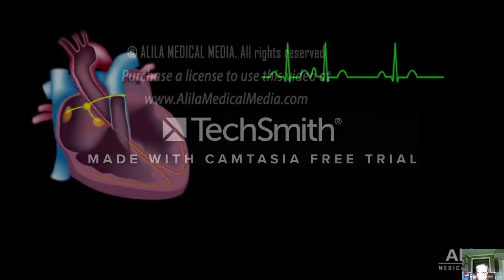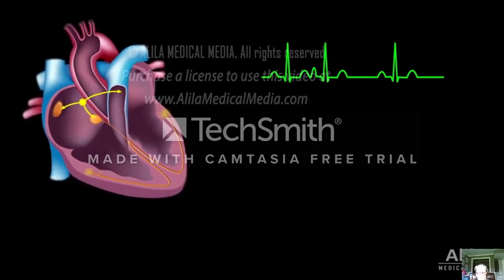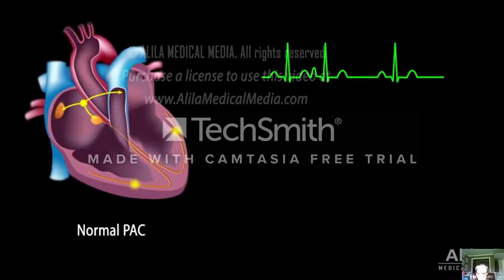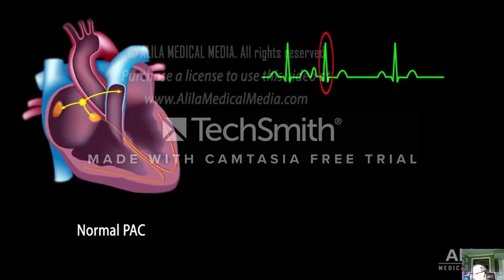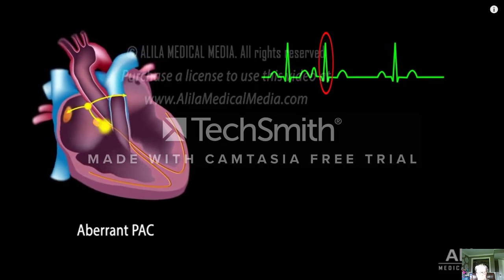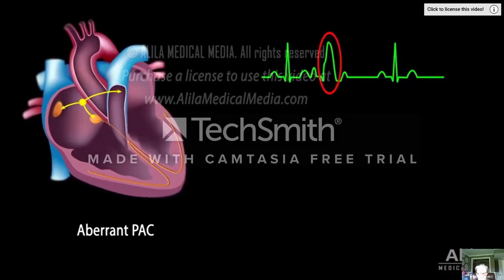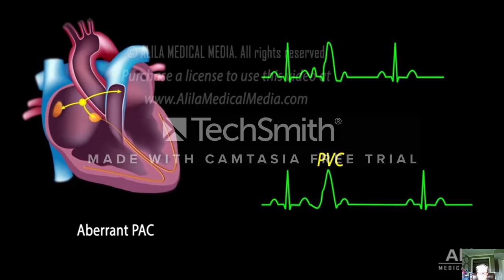The downstream ventricular conduction of a PAC can be normal, aberrant, or absent. In most cases, conduction through the AV node and ventricles is not affected, resulting in a normal, narrow QRS complex. Occasionally, however, ventricular conduction may be aberrant, causing a widened QRS complex, usually with right bundle branch block morphology, which may look similar to a premature beat of ventricular origin.